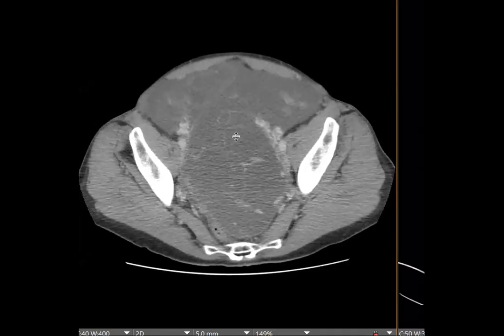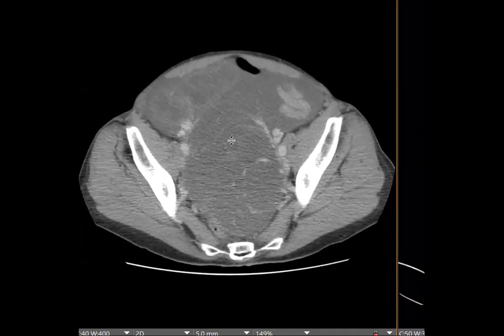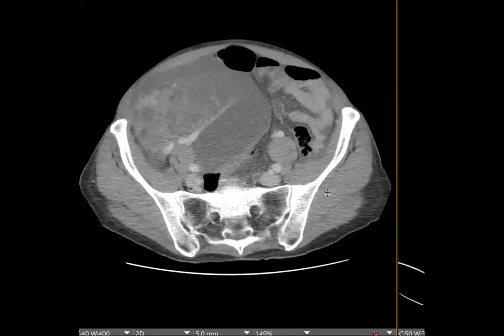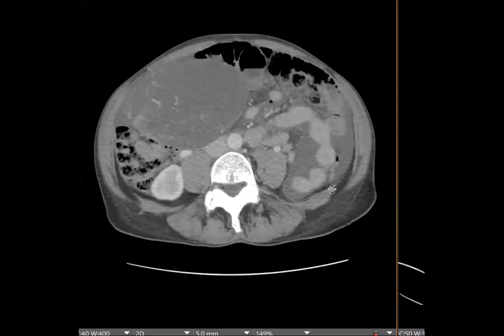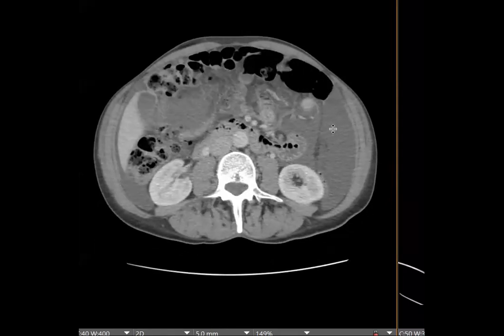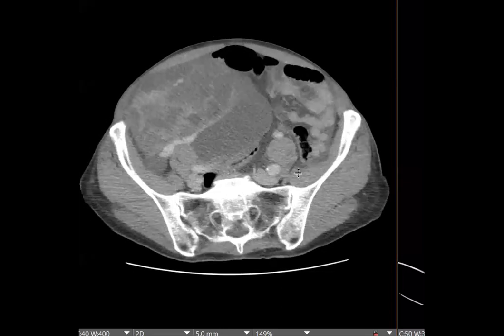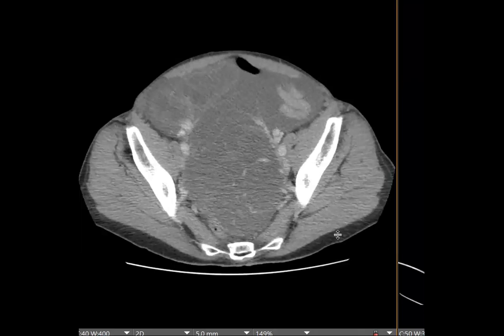And if you see these involving both the ovaries. Yeah, it's like a GI primary with metastatic disease to the ovaries. Okay, excellent. You're absolutely on the right track. So yes, these were mucinous metastases to both ovaries, but the primary was a little surprising.